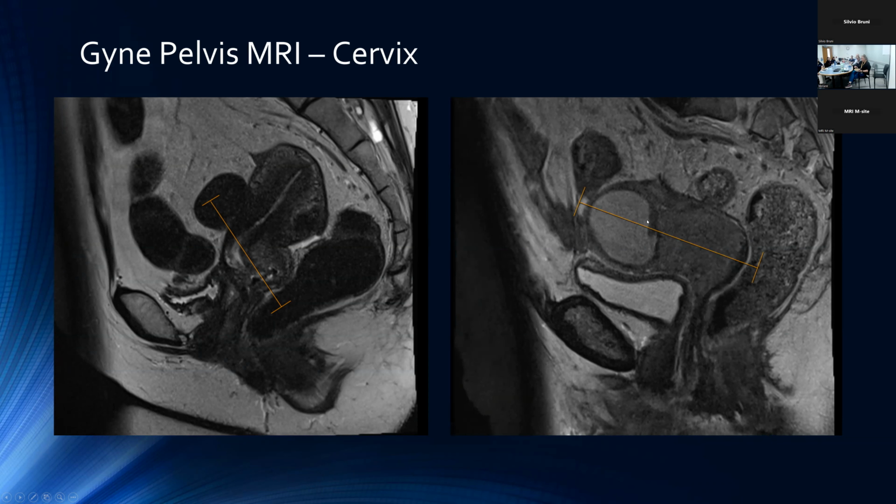And you can see a line can be drawn nicely along that bulk of the cervical tumor, which again generally replaces the normal orientation of the stroma. It'll just approximate that same orientation, and you can see generally what we would hope for planning that line.